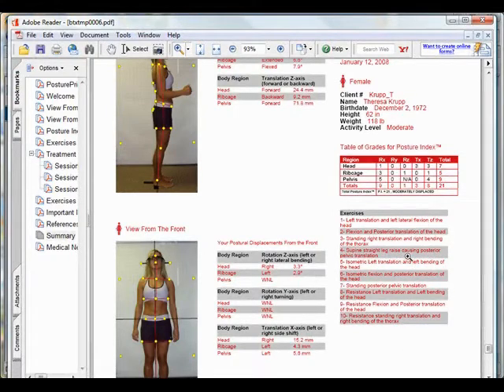Now, in my practice software that I use for my office, I can actually put this PDF or JPEG image right there, so I can pull it up in real time. In about 1 to 2 seconds, I can have this open up for me when the patient is at that visit.